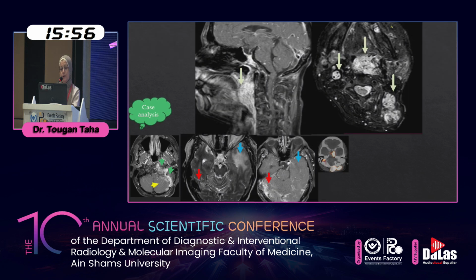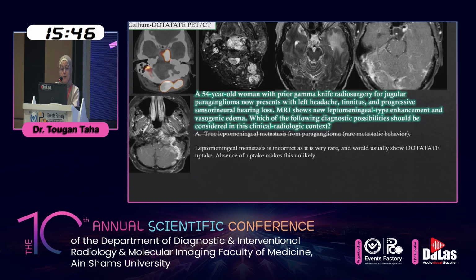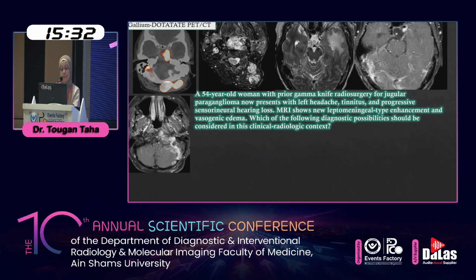Other images for the patient show other similar lesions in the oropharynx, in the left paravertebral, and in the carotid spaces. So back to our choices. Leptomeningeal metastasis is incorrect as it is very rare and it would show dotatate uptake. Absence of the uptake makes this unlikely.